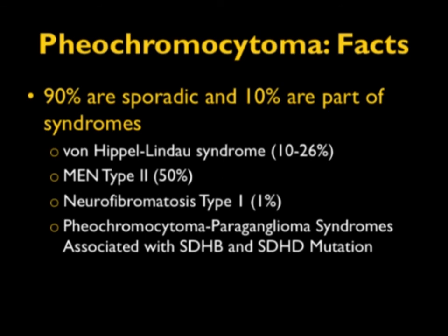Vascularity is key, anywhere between 120 and 190 Hounsfield units on the early phase imaging. They can wash out quickly. That's why we make the point that if a lesion enhances above 110, surely 120, you can never call it an adenoma. I don't care how it washes out. I'm always going to worry it's a pheochromocytoma.